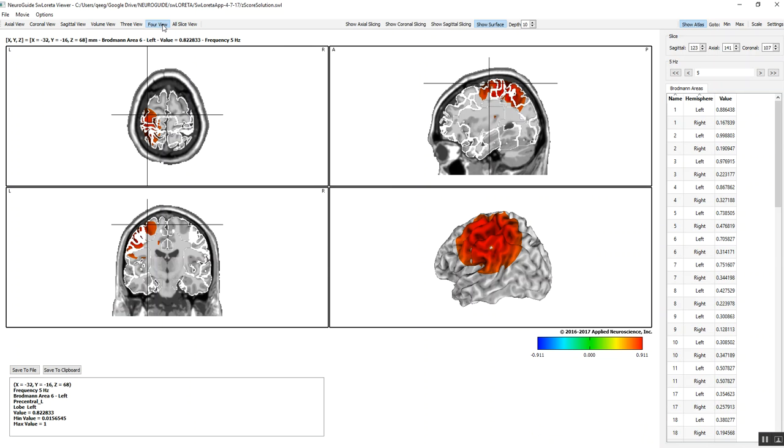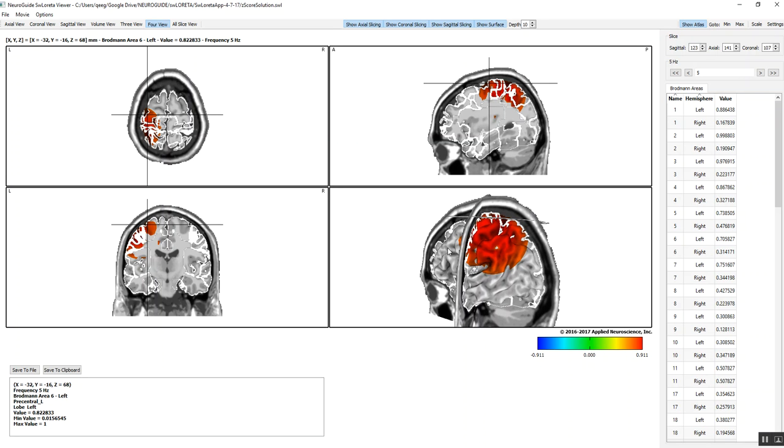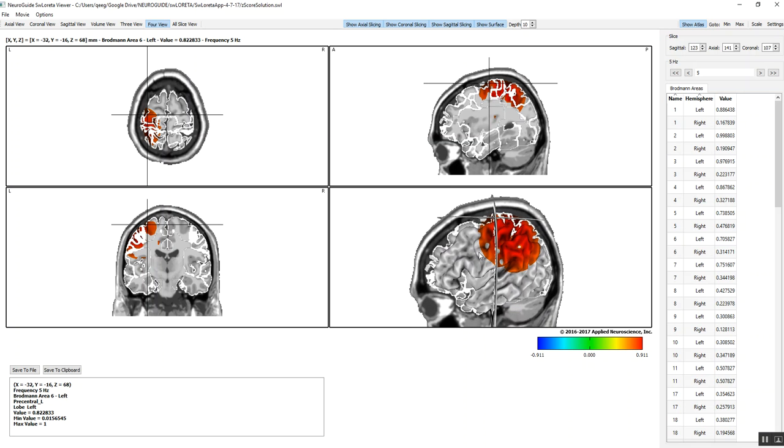Typically we're working a lot in the 4 view because you get a very good view of what's going on this way. But we also can evaluate these views by superimposing the planes, the coronal, sagittal, and horizontal or axial planes. So, for example, this is the axial plane.